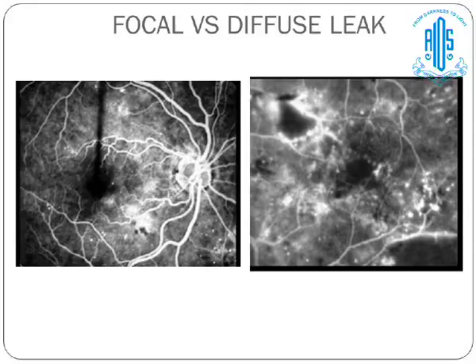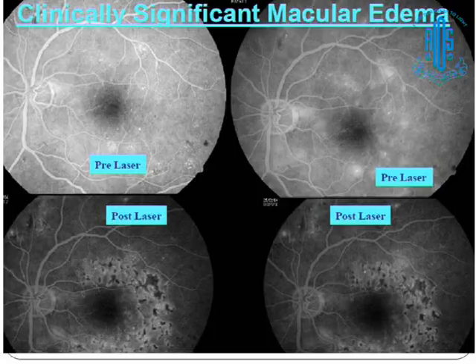followed by laser. Now, in clinically significant macular edema, there is a pre-laser angiography. We can see the leakage, and post-laser, the leakage has gone.